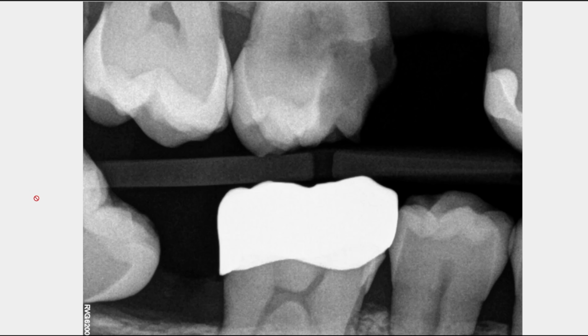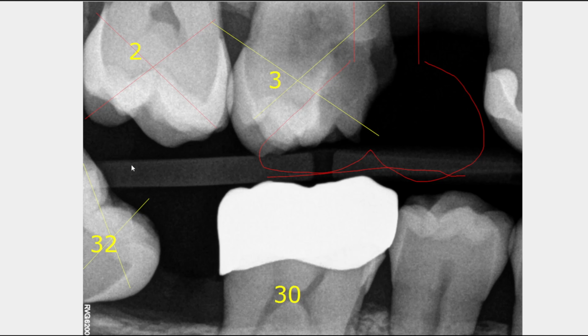And the bite wing is by far the most useful one for treatment planning because they can see this. They can see their bite coming together and how this tooth number 2 isn't even being used. So why are we saving it when we can just take out all 4 of these teeth right here, replace it with one rock solid implant and get him back to healthy? So these are literally the images I showed to the patient just 5 minutes ago.